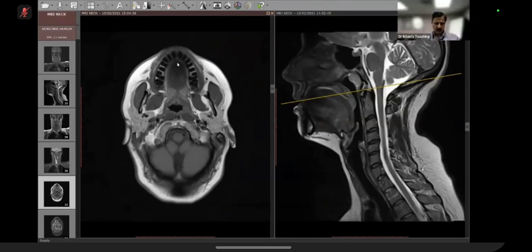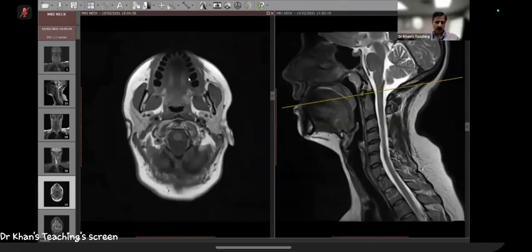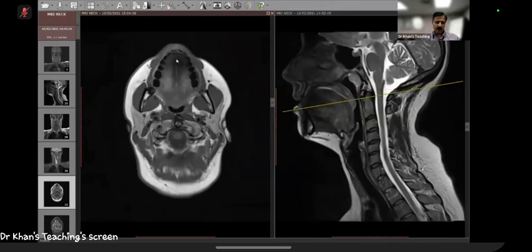So you can see this tongue here. So this has to be the intrinsic muscles of the tongue. So this is tongue, this is the septum. Tongue has got some fat also, and that is why on a T1 weighted sequence you see it very well. And if you do some staging of tongue carcinoma cases, please remember, if a tumor extends through this septum to the contralateral side, it becomes a T4 tumor because they have to remove the whole of the tongue.